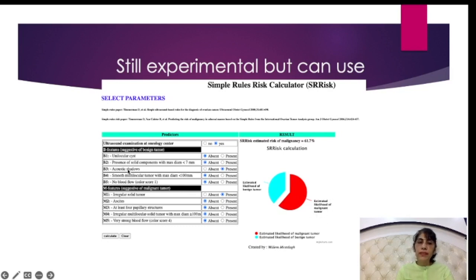Right? What two features have we just chosen? One is that there was an acoustic shadow present, but the second was that it was an irregular solid tumor. If I had just relied on my typical distinct appearance, I could have thought that there is an acoustic shadow, this is likely a dermoid only, but in some cases it may turn out to be a different thing altogether.